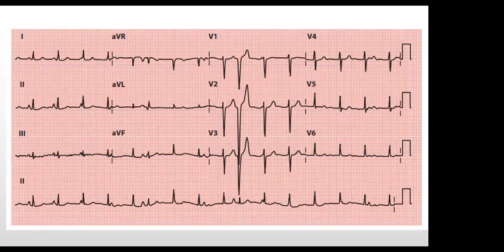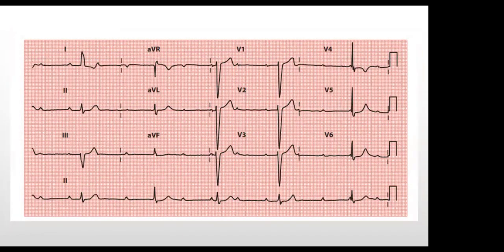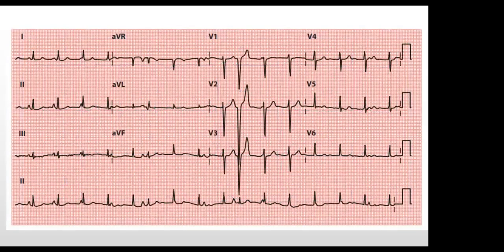Okay, how did we get here? All right. Because of time, I have a lot of ECGs so that we can go through as many as possible. We've done a lot of blocks. What do you think this is?